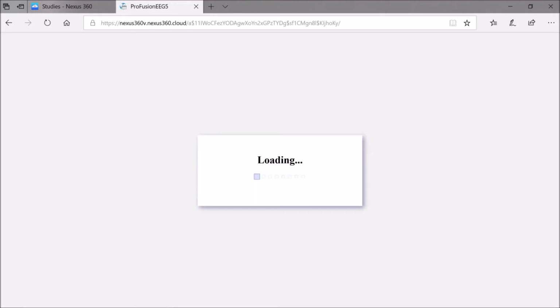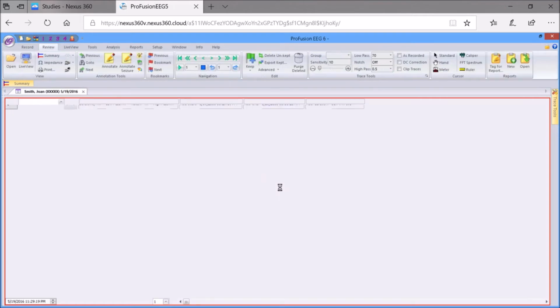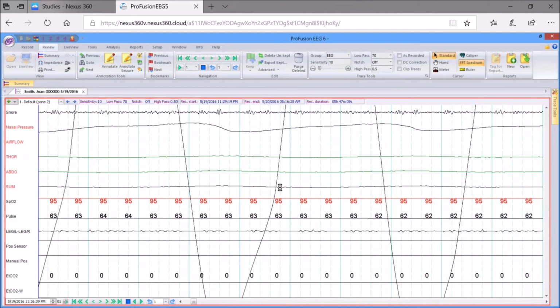Having said that, there are going to be some settings you might need to go through and have a look. So some of them, for example, here we said there's an airflow signal that's just way out of range here or off screen. So we need to play with our axis settings a little bit to make sure that they all appear as you would like. But all the data is actually there.